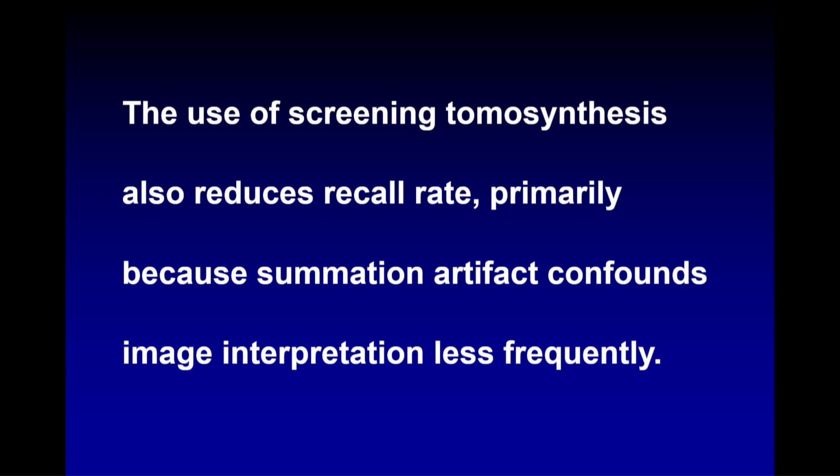If it's a true focal asymmetry, you will see it in sharp focus on several adjacent slices. And it will have concave outward contour. And you'll see it even better. If it's not real, it'll just spread out. And there won't be anything there, and then you just don't call it.